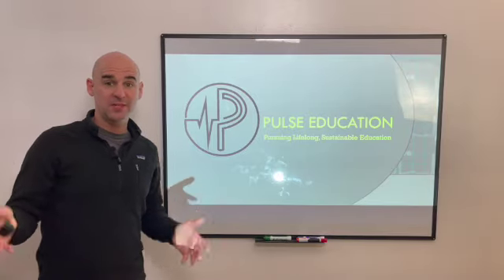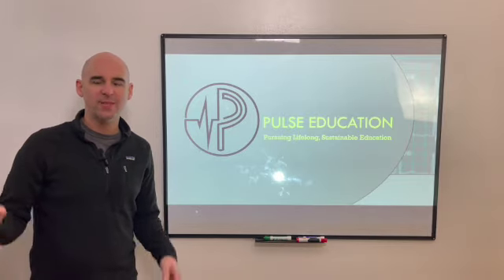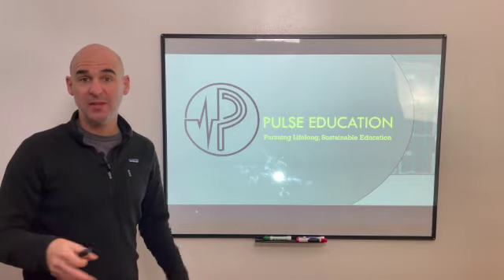All right, this is your video on rate and regularity, step one of the disciplined approach to 12-lead interpretation.